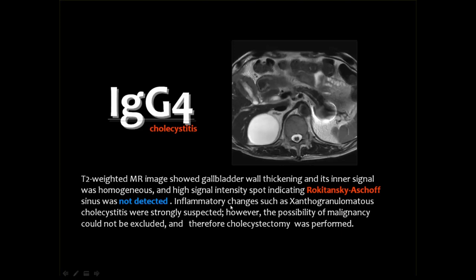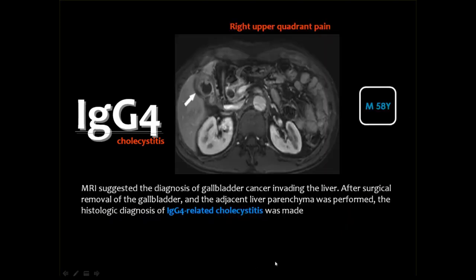And also, you do not see significant inflammatory changes around the gallbladder. You remember that this lesion may simulate xanthogranulomatous cholecystitis, and you remember also that xanthogranulomatous cholecystitis in some cases cannot be differentiated from gallbladder cancer. Then cholecystectomy was performed, and it showed IgG4-related cholecystitis.